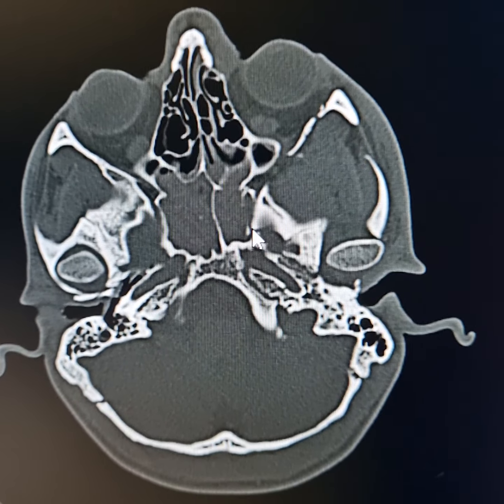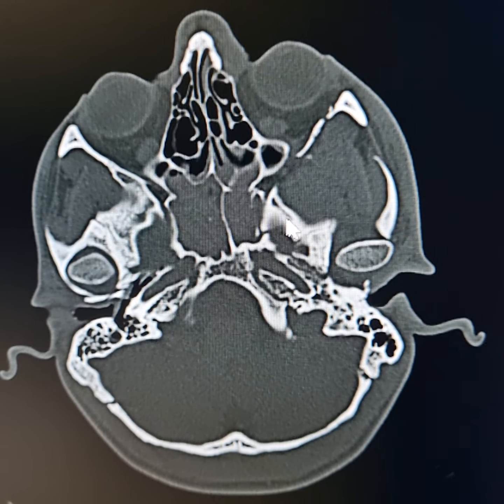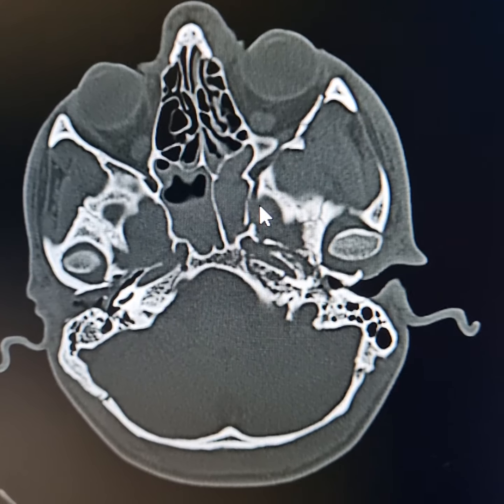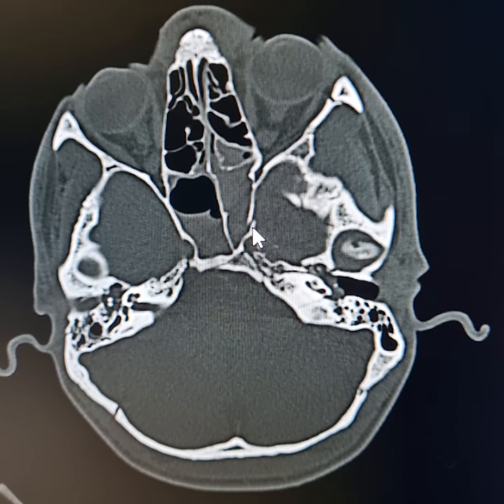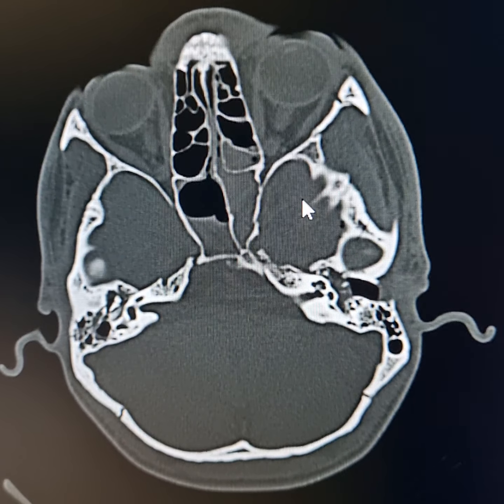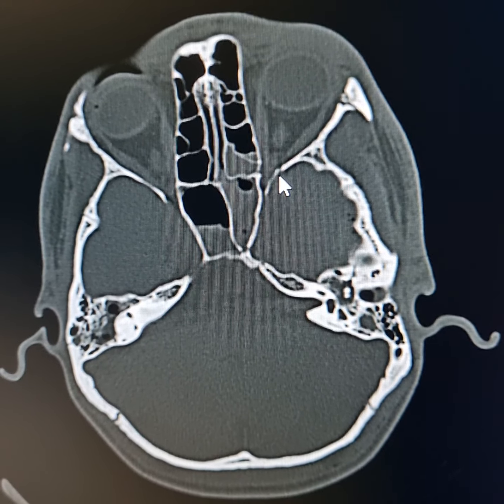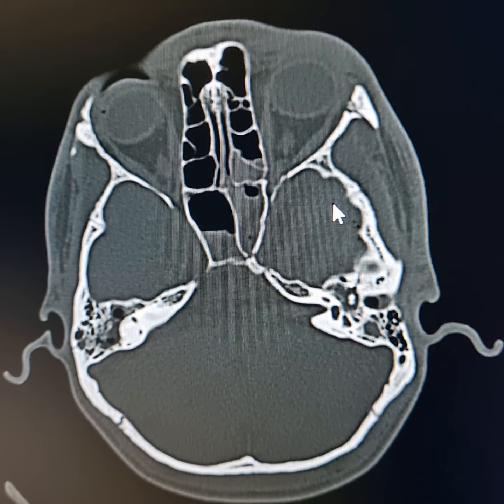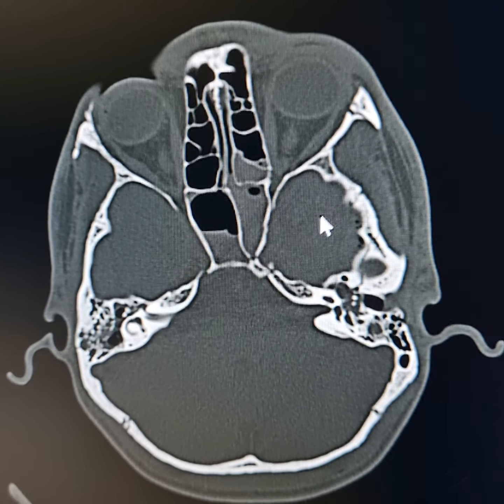Now, as I trace it here, you find a comminuted fracture of the left greater wing of the sphenoid and the lateral wall of the left sphenoidal sinus. This one here. There's a fracture involving the lesser wing of the sphenoid as well, which has involved the lateral wall. This one here. This has involved the lateral wall of the optic canal, because the patient had symptoms in the left eye as well.